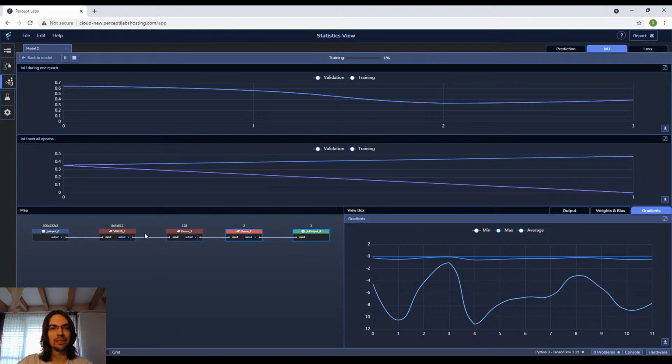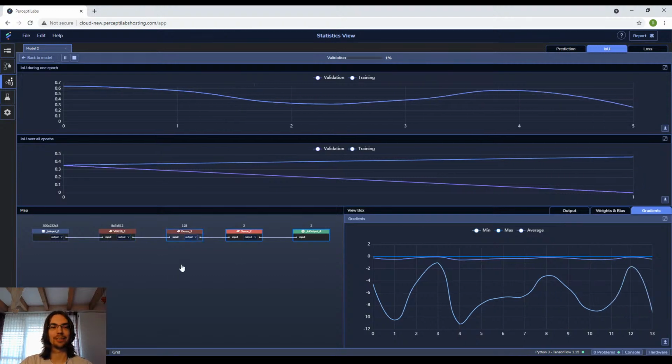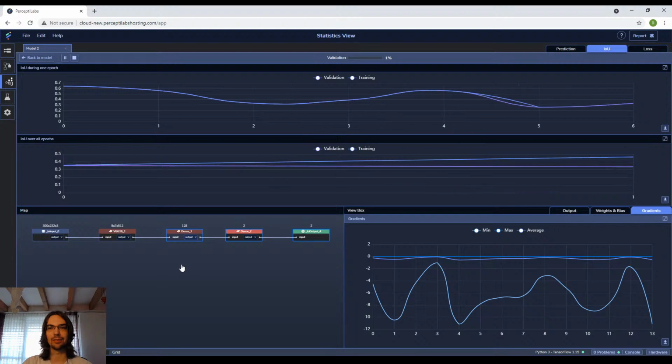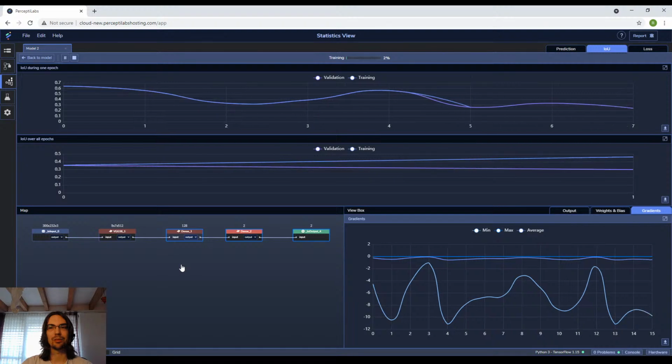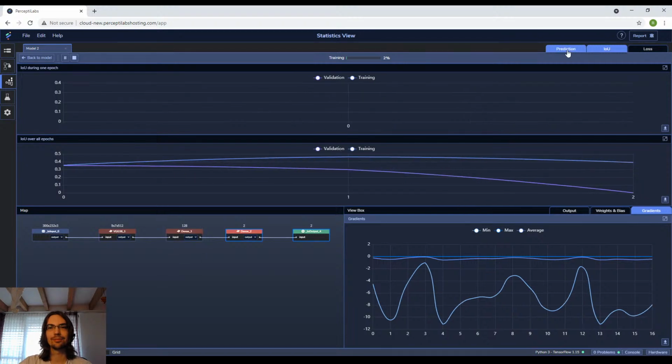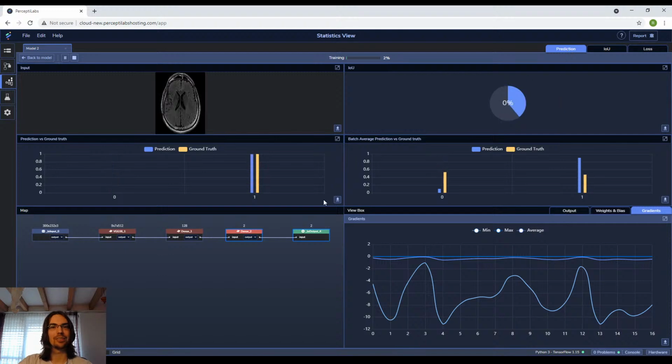With the VGG here doing a lot of the feature extraction, and it's been trained on a lot more images with quite a lot of complexity, this probably should learn pretty well to tell these apart. And if it doesn't, we will try something else real quick.